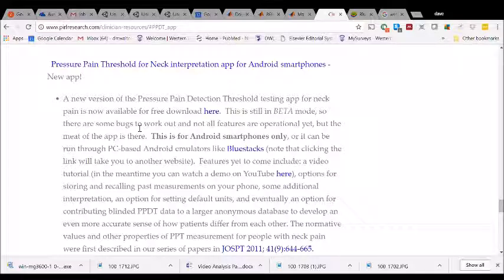In newer versions of Android, you can indicate that you just want to do that for this particular installation, not for every installation, because if you leave that feature on, just be aware that it leaves your phone vulnerable to malicious software. I'm going to run through this assuming you do not have an Android-based smartphone. Unfortunately, I don't have this available yet for iOS-based devices.